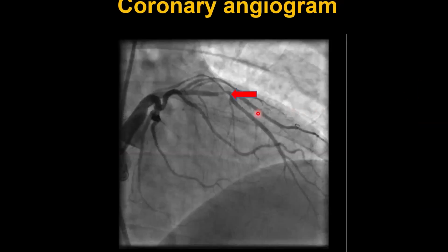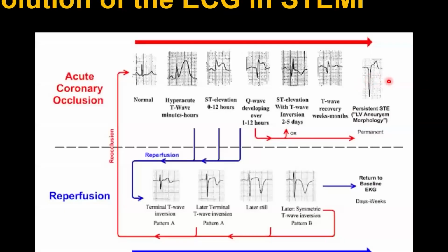And there's the lesion right there, on that coronary angiogram. The explanation: those T-wave inversions in V2, 3, 4 were described by Dr. Hein Wellens, a Dutch cardiologist, who described a series of cases where people came in with chest pain that had resolved, and then they had these T-wave inversions. And if revascularization was not undertaken, they went on to have large anterior infarctions.